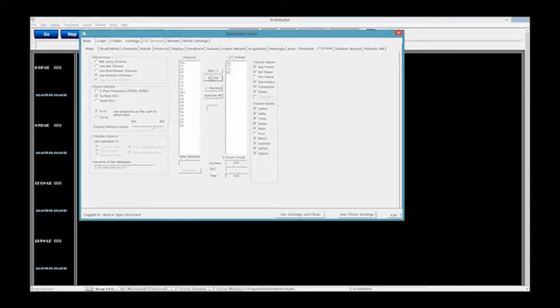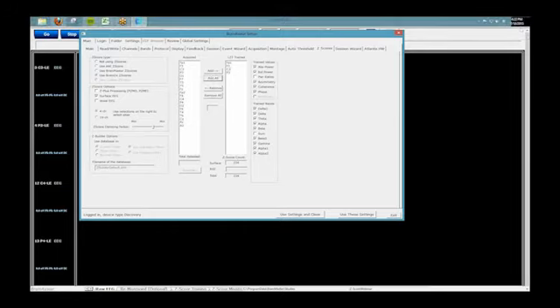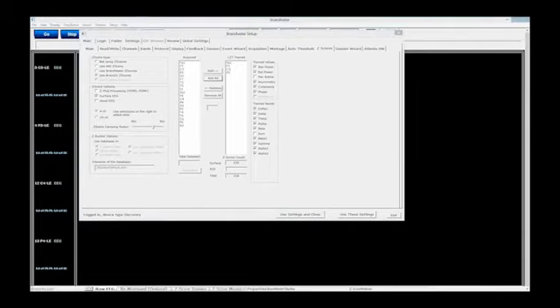But what just happened right there? I'm only seeing 4 Z-scores over here. Why am I not getting all 19 channels? I want to add them all over there. So as I was saying right here, FP, F3, C3, P3, that doesn't make sense. I want 19 channel Z-score training.